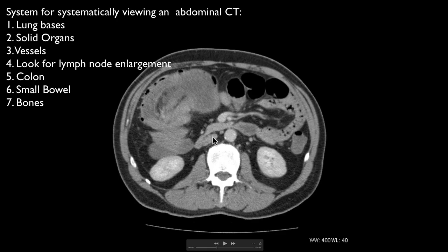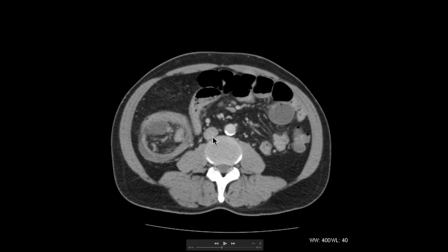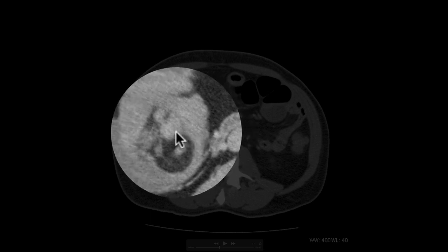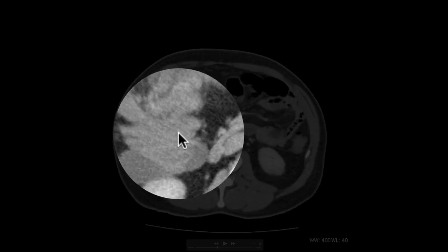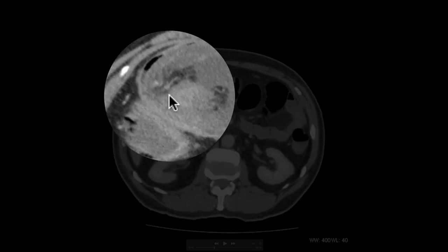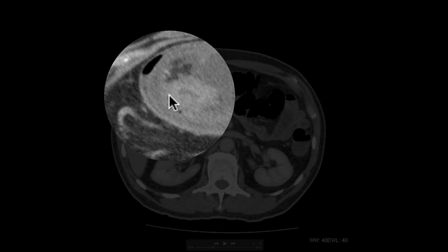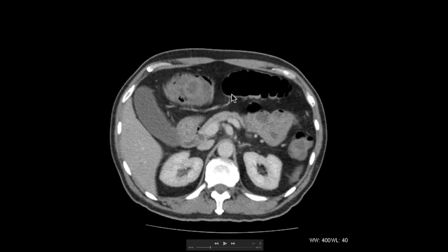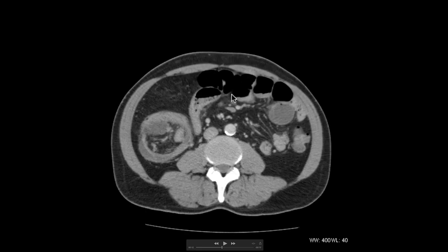I'm sure your eagle eyes have already picked out the abnormality here. This is a great example of a patient with some bowel pathology. This is the ileum coming down towards the ileocecal valve. And as it passes up, you can see this very abnormal looking bit of bowel, and you can see this cuff of fat around the small bowel as it's going into the colon. This is a patient with intussusception. So you've got the bowel being pulled through within the large bowel, with this fluid and fat around the outside. And this was a patient who had a malignant lesion near their ileocecal valve, presenting with intussusception.